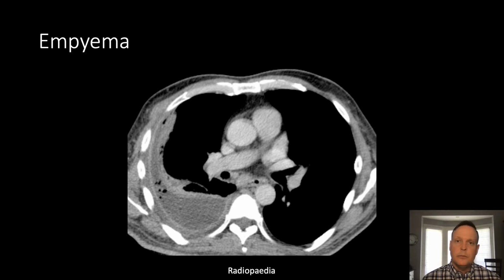In an empyema, an infection has been introduced into the pleural space, and in that reaction you get a thickening of the pleura. So in this example of an empyema, we have thickened visceral and parietal pleura, also known as the split pleura sign. This is also a contrast-enhanced study, making it a little easier for us to appreciate the thickened pleura. Also, the distribution of the fluid in the pleural space is not entirely dependent, as it courses along the lateral aspect of the lung.